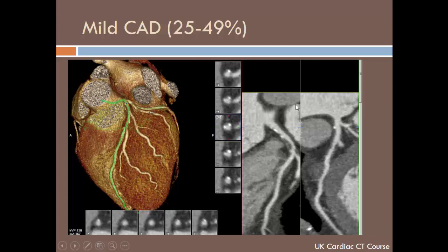So in this one, you have the plaque. You have calcified calcium here. You also have a non-calcified element there. So at this point, where my blue marker is in the plaque, we're describing this plaque, for example, because that's what I'm showing here. The plaque is of mixed nature. It's got focal calcifications, and there is a non-calcified element.